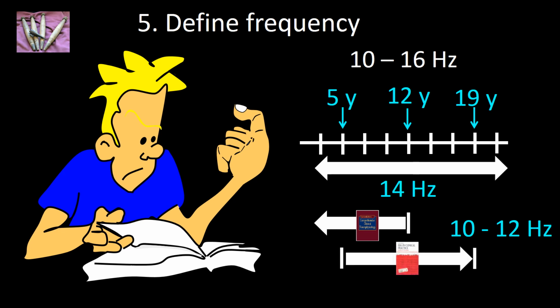And in Hughes' book, they talk about 10 to 12 Hz spindles being seen after 5 years of age and up to the age of 19 years. The bottom line is that whether, just by the frequency, spindles can be divided in two groups, those that are above 12 Hz and those that are below 12 Hz, usually in the 10 Hz, is always an open discussion.